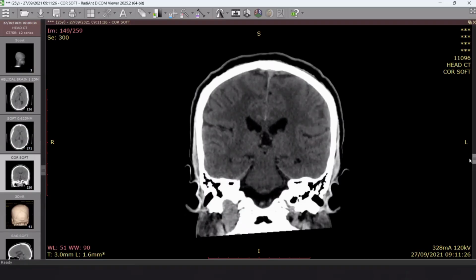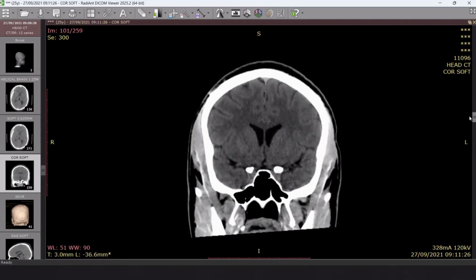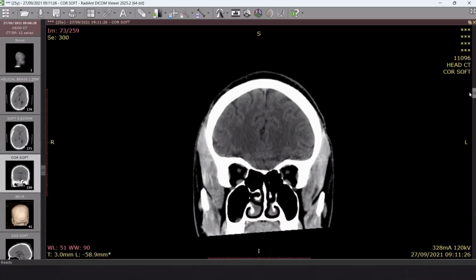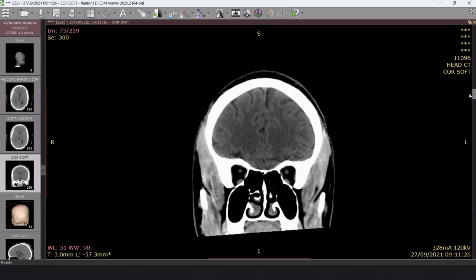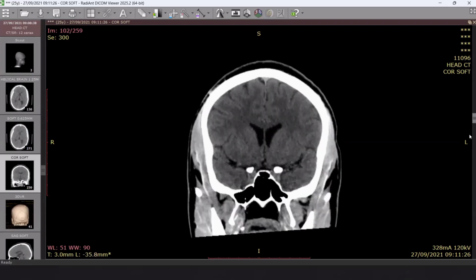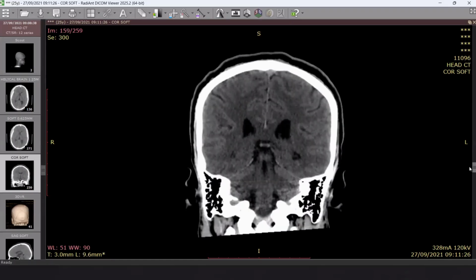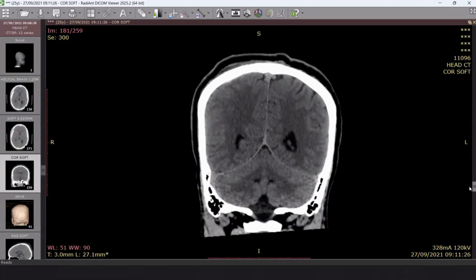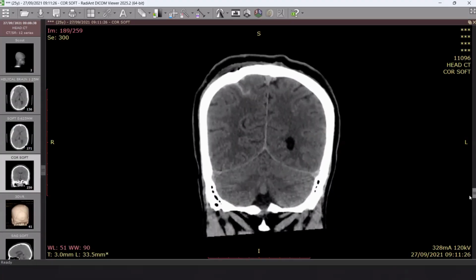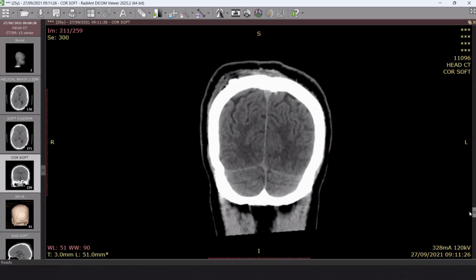Let's focus on the side of the trauma, please. Do we have subarachnoid hemorrhage as you said?